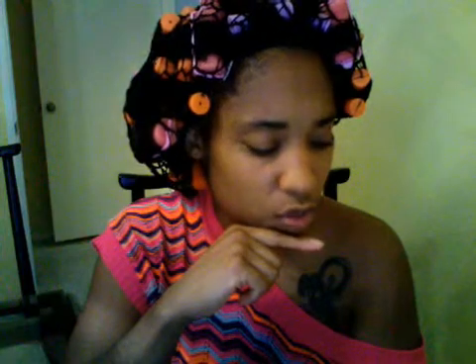Now on your test, on your average test, supposedly, you will have a 6-second strip. But you can't always assume that it's a 6-second strip. I think the way they were saying that you would know is that if it's 30 of the large squares. So if you have a strip in front of you and you count out 30 of those large squares, that should equal 6 seconds. Sorry if I'm wrong.